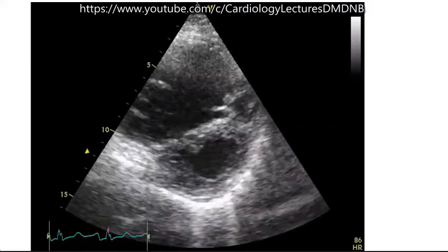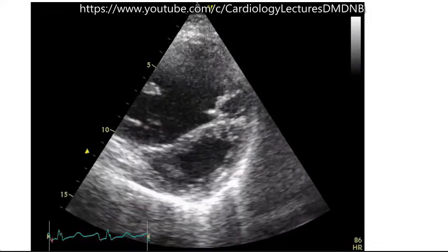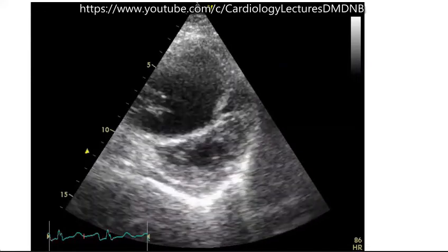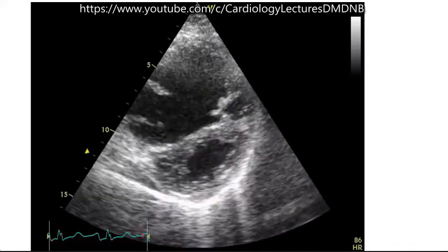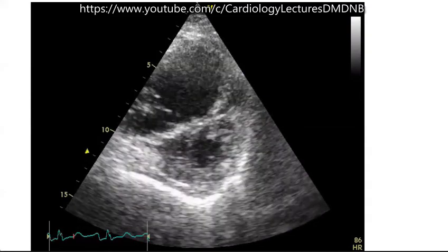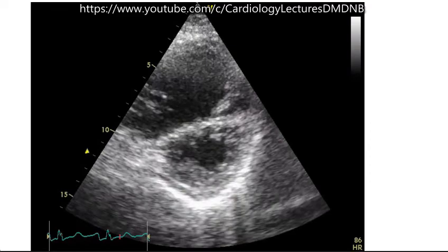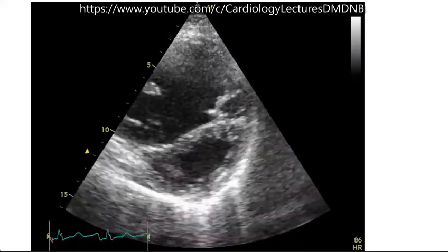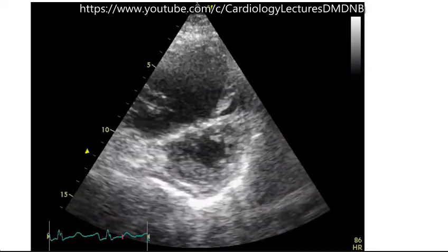During systole, the D shape is increased. So it appears to be pressure overload. RV pressure overload, sir, pressure and volume both. Yes, there is volume overload as well as pressure overload. But do you think the pressure in the RV is suprasystemic, or maybe near about LV, or equal to LV? It looks equal, sir. Yes, because there is a bulge during systole, in the early phase. There is a bulge of the interventricular septum onto the RV, indicating that probably the RV pressure is not suprasystemic.